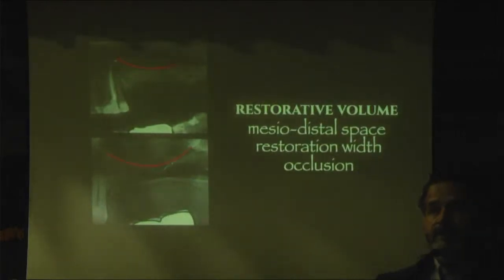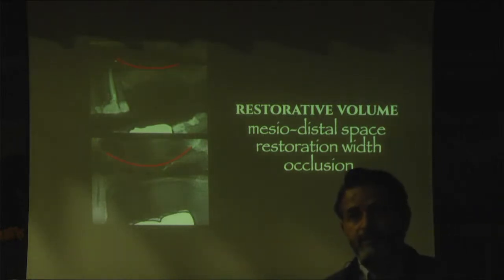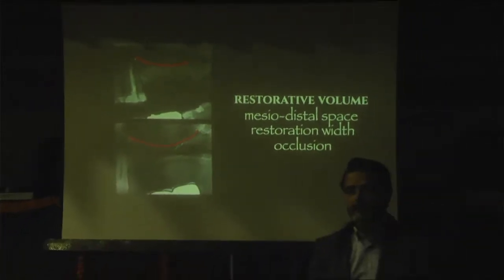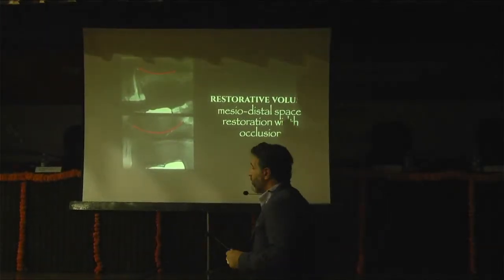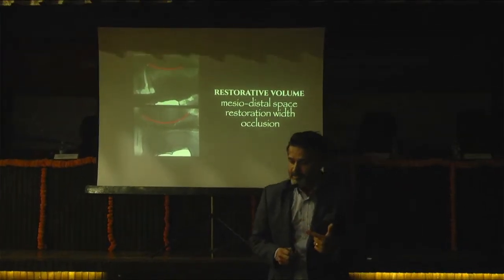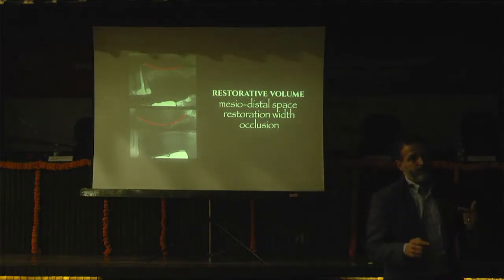When a patient like this has a missing tooth in the left upper side with a pneumatized sinus, and is suffering from the lack of teeth, lack of mastication, and lack of eating properly, when we see the X-ray, first of all, we have to think about the restorative volume. We have to think about the mesiodistal space, the restoration width and occlusion. But when we see the X-ray, they don't come into our minds.